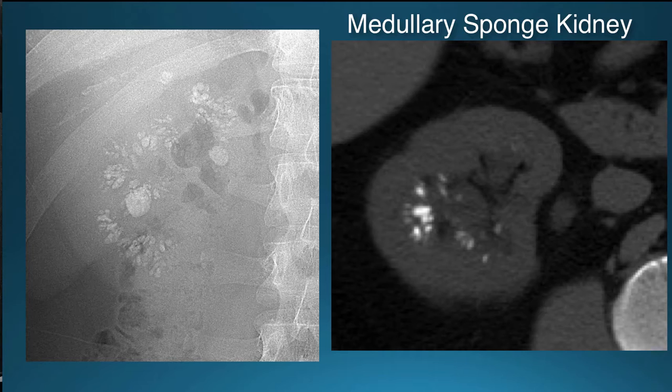and that anatomic aberration can be asymmetric between kidneys, or as in this case, unilateral, or even within only a portion of one kidney. The other conditions tend to be metabolic and generalized, resulting in medullary nephrocalcinosis that affects both kidneys generally.